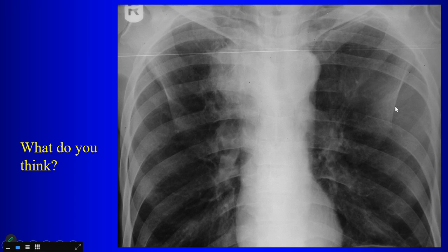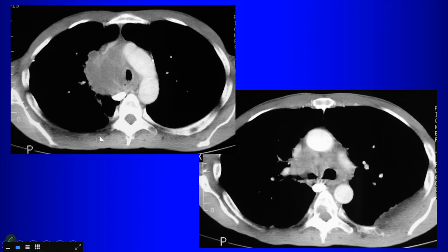Okay, so how do you interpret that? Well, if you have what looks like a tumor here and a bone is missing, right? Metastatic disease, right? So certainly now we're really thinking about cancer. So here we go. Here is the soft tissue mass in the rib, causing the rib to be missing. So what kind of tumor do we think this is?